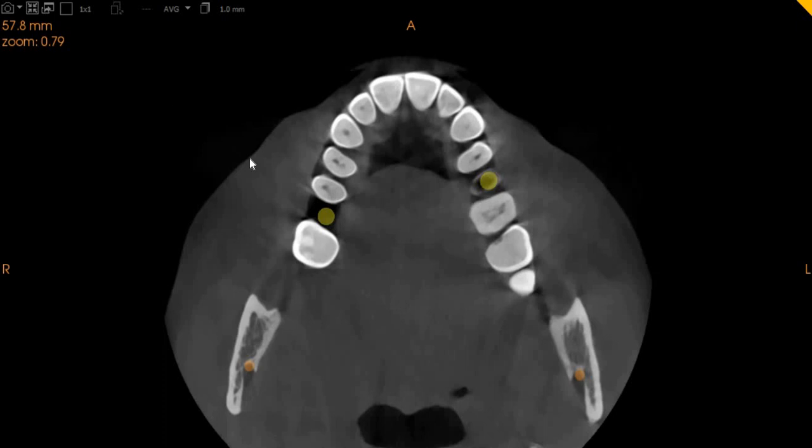Again, very little interocclusal space. Just to give you an idea, we've got only 5.4. So again, enameloplasty of the 7 and enameloplasty of the 5 will be needed in order for proper crown placement post implant.